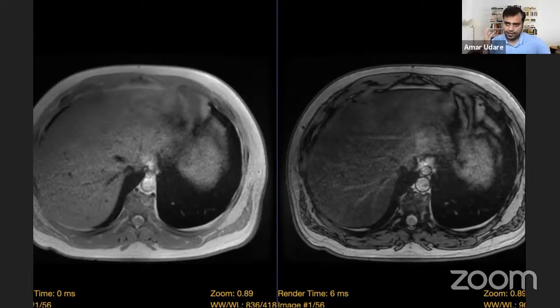Remember, this is a common mistake that a lot of radiologists and residents make. On a CT, if you're looking at an adrenal lesion with obvious fat, so the density matches that of subcutaneous fat, that is not an adenoma. That's an adrenal myelolipoma. Although it doesn't make a big difference, as both of these are benign conditions and nothing needs to be done about that, you need to understand the pathology better. So macroscopic fat in an adrenal lesion is myelolipoma. Microscopic fat is adrenal adenoma.